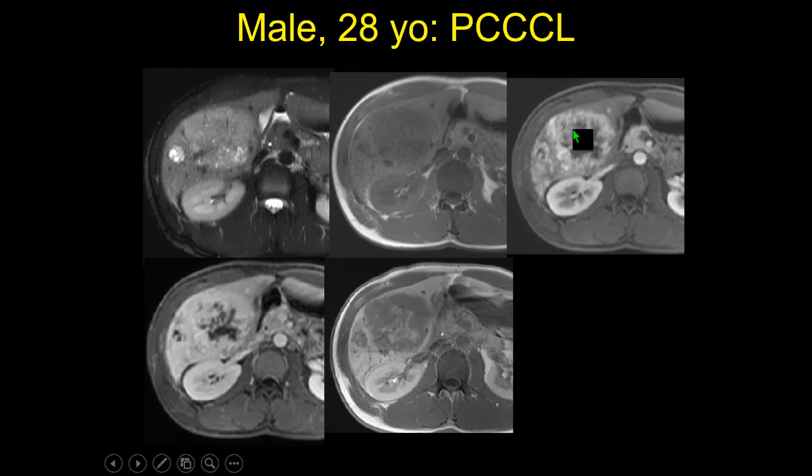Once again, you can see here, hyperintense, there is not a clear washout in reality, and this is a hepatobiliary phase with BOPTA, where the fibrotic and necrotic component of the HCC markedly appears hypointense, such as this satellite lesion. And histology was clear cell carcinoma of the liver.